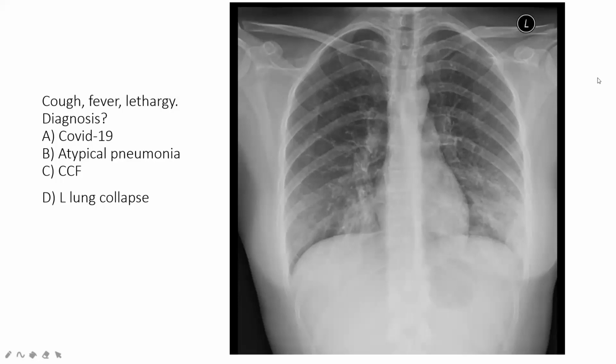Is it COVID-19? Is it atypical pneumonia? Is it CCF or left lung collapse?